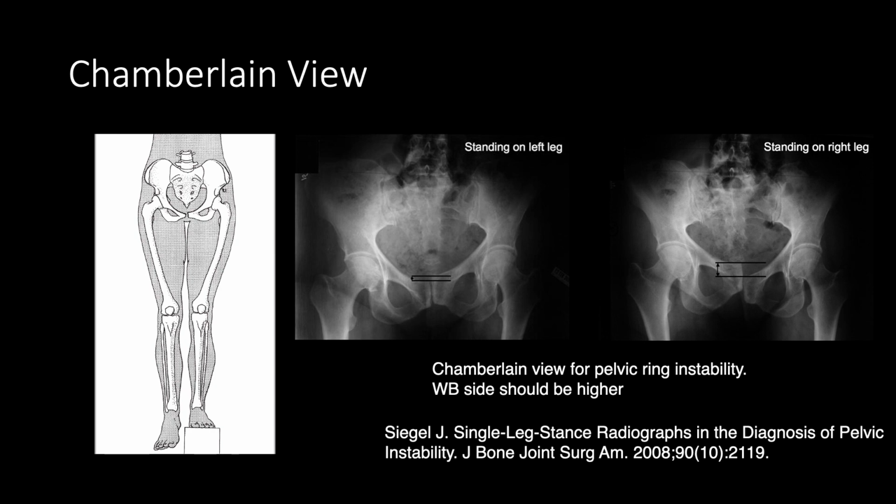So the primary ones that you'll see in practice are going to be the AP of the pelvis. You may see the AP lateral view of the hip. Those are the more common things that you will see with the orthopedic practice. So hopefully that helps your view. Look at your textbook as well for some other better pictures, and we'll move on to radiography of the knee next.